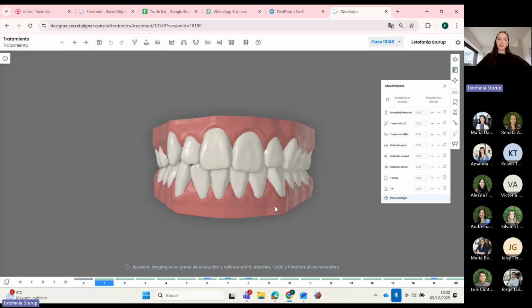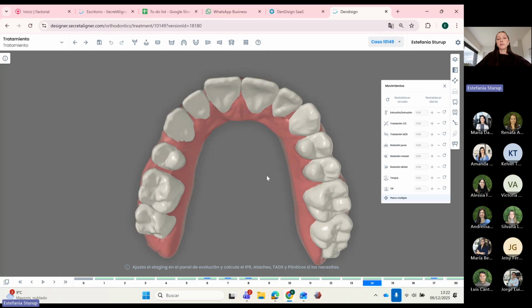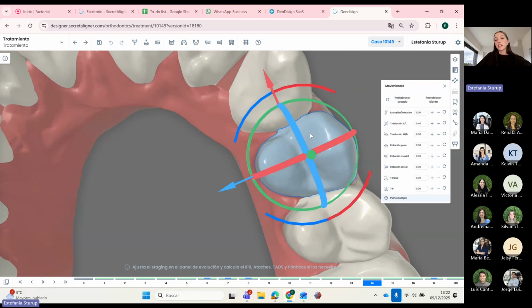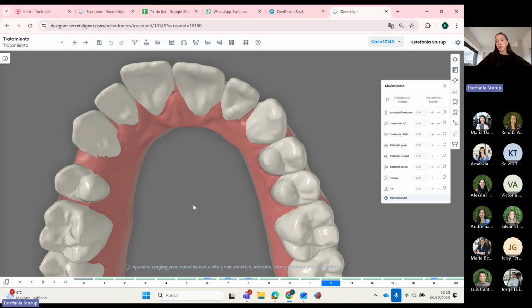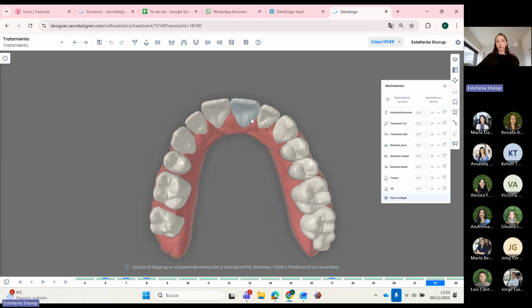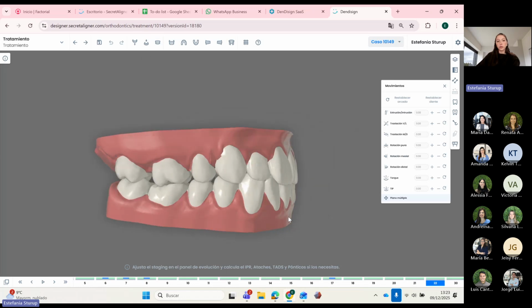Just note, I also said this in the last webinar, but if you, by any chance, close the window or the server or anything, it automatically saves, so you won't lose any of the work you've done. Okay, so let me go ahead and here. Okay, this is how we want it. Perfect. Great.